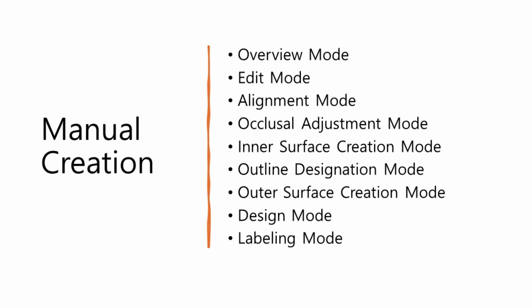The inner surface creation involves setting parameters for blockout direction and amount, inner surface offset, and smoothness, all contributing to the fit of the splint.